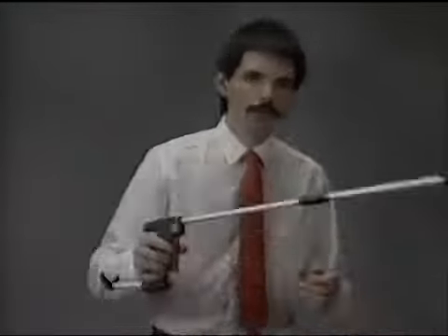Okay, now that we've looked at environmental control of very large areas and moving around our environment, let's talk about environmental control in a very localized way. We talk about activities of daily living aids, devices that allow us to pick things off the floor or turn knobs or make life a little easier for us. An example of that is a device called a reacher.